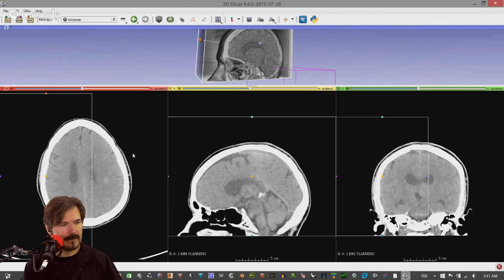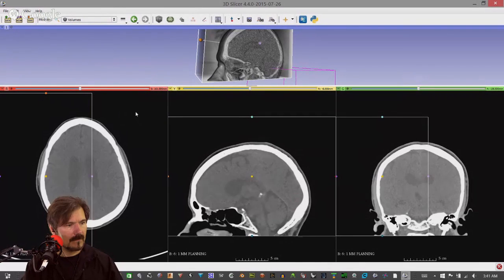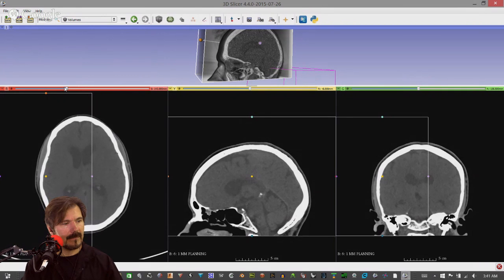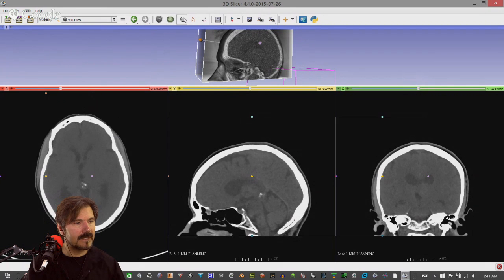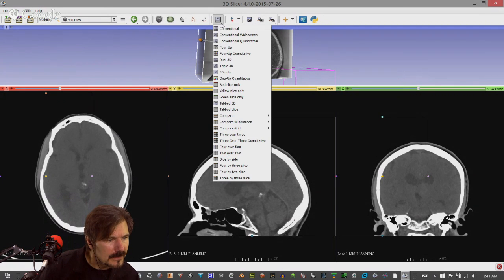Okay. And what you're going to want to do is scroll down a little bit and adjust the window to make it a little bit darker. Yeah, like that. And then scroll down a little bit. Okay, left to right. Keep going, keep going. And if you can see it, just because I'm doing this watching your screen, yeah, kind of exactly where your pointer is, you'll see there's in the left thalamus. No, it's not that white actually. Again, I'm looking through this onto your screen, just because mine's still uploading here. Let me see if we can go to just.